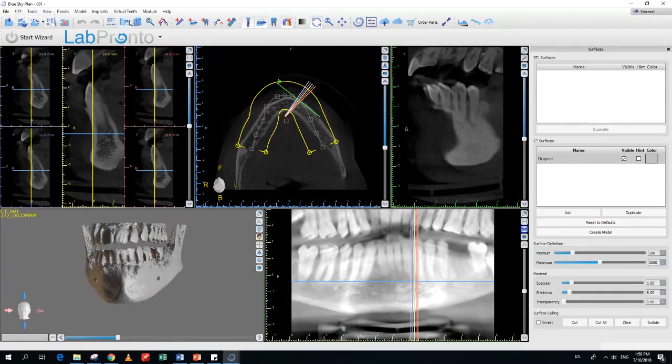And we have our model manipulation panel, which will allow that. But just conceptually, in order for the buccal bite registration functionality to work properly, and we're going to have the same thing with the denture module when that comes out, is you want to have the generally correct orientation.